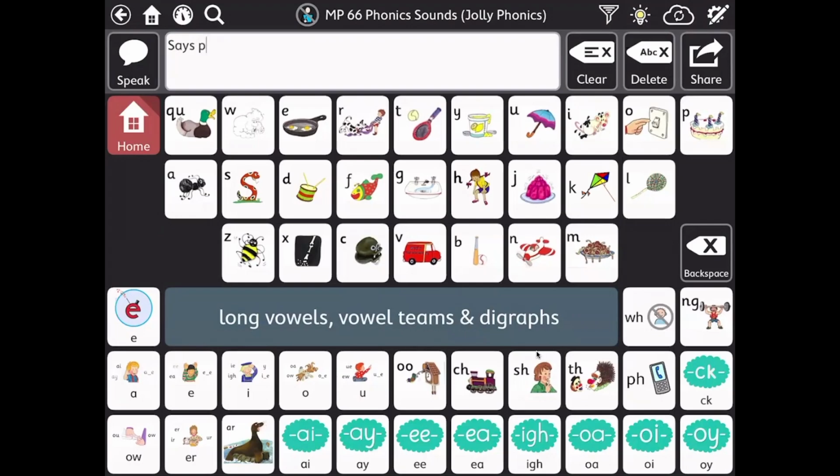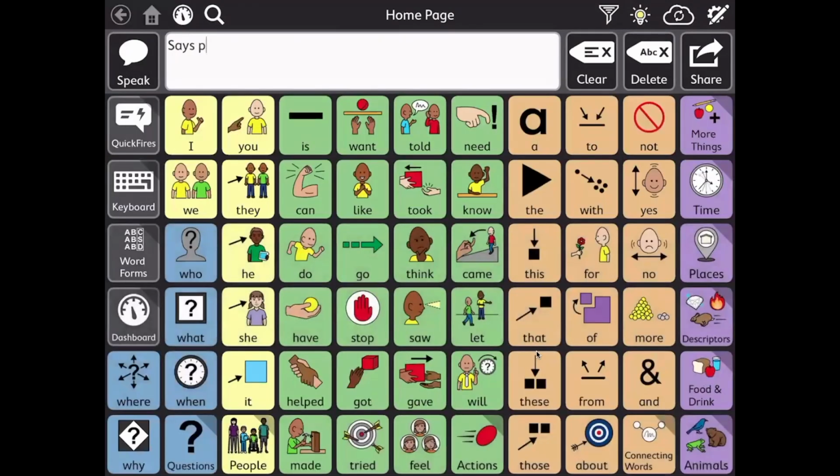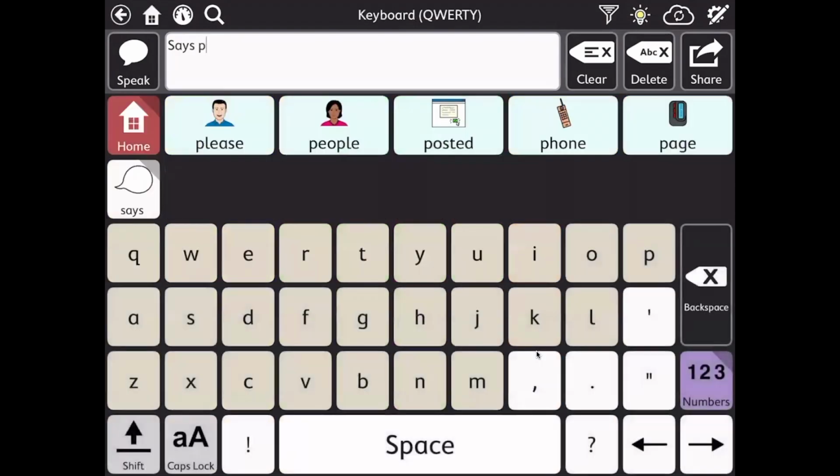a school team really wanted this, and this is something that you can download on the My TobiiDynavox platform if you have an account. And fantastic AAC guru, Angela Murad, added it and demonstrated how to do it. And so I can include that link in this video, but lots of teams really do like that. And I just called it says. It doesn't need to say that, but I wanted to say like P says.